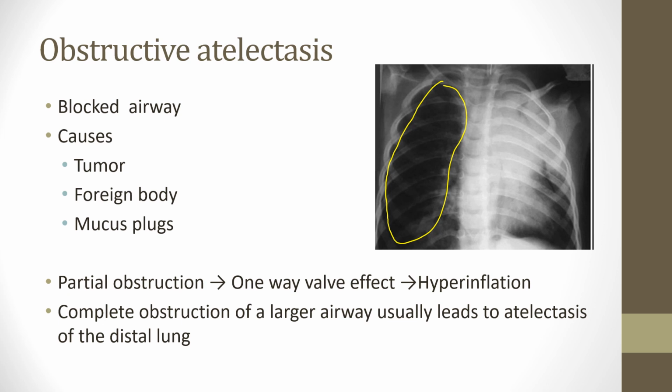And you're going to have a really bad issue there. So that right side's hyperinflated, because where do you think this patient is intubated? You can see the tip of the ET tube down there. So this patient's intubated. So where do you think, as the ventilator is delivering the breath, where do you think most of the gas is going? Here's the carina. Most of the gas is going over here and hyperinflating and destroying tissue. Boo. That's ventilator-induced lung injury. Just say no. Down here is a mucus plug.